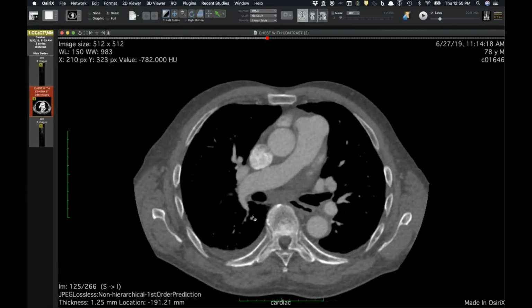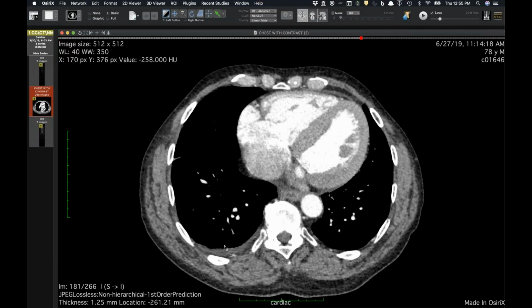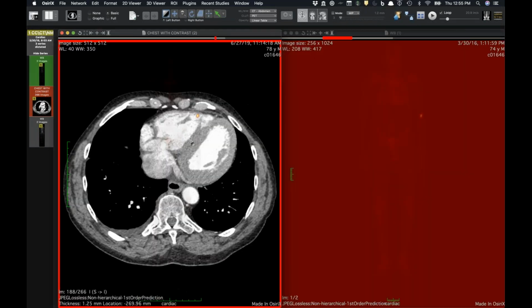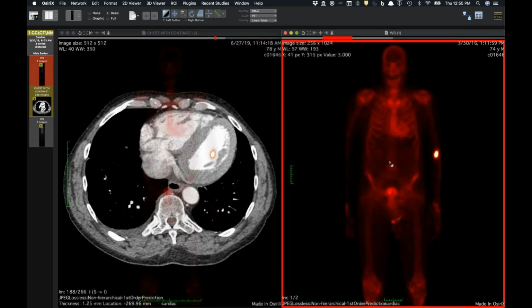This one, the CT is not that interesting. I just saw the CT, and this guy has prostate cancer. He's in his 70s. He's got a small effusion. His LV is a little thick. The interesting thing about him is his bone scan, and I don't know why it came up in red, but it looks cool. And you can see he has myocardial uptake more than his kidneys.